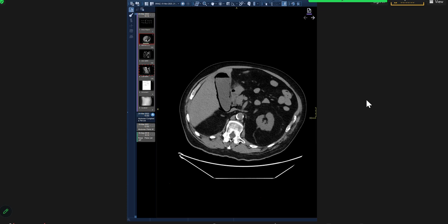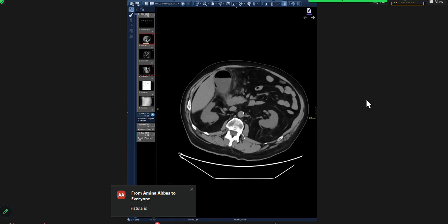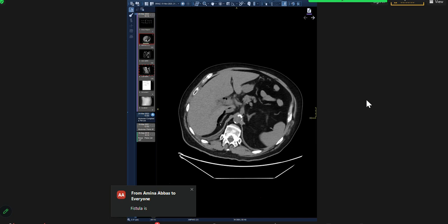All right. So the thing is that because of the air, what would you call it? Because of air, so it's an emphysematous cholecystitis. With air-fluid level, or with secondary infective changes, or perforation? With perforation. So emphysematous cholecystitis with perforation, right? Okay. Yes. And we didn't see any stones on this.